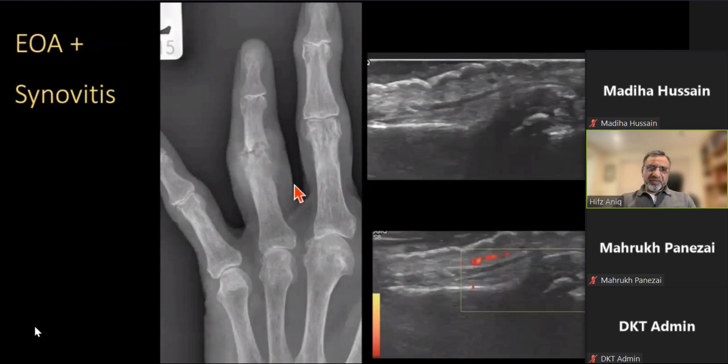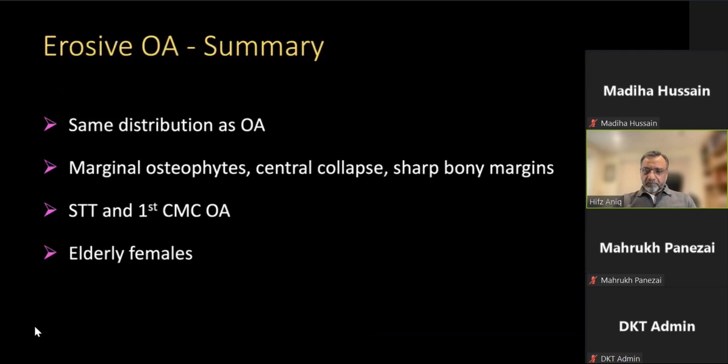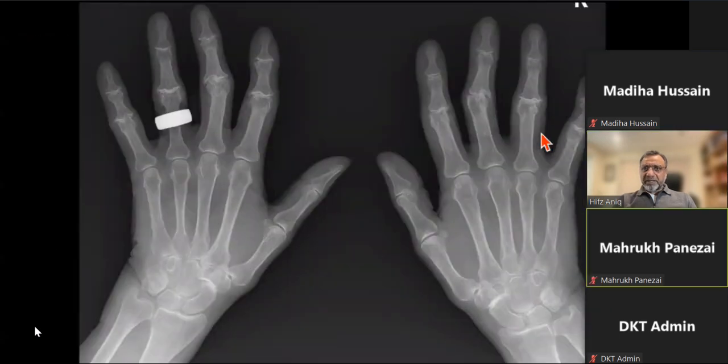So this is the radial side on my right. You can see that it's a little bit towards the radial side, the valgus. You always look at the distal part of the joint: varus, valgus, anterior and posterior. Okay. Yes, sir. In that case, you can see that it's going towards the middle and going out towards the ulnar aspect. So this is varus in this case. Exactly. Okay.